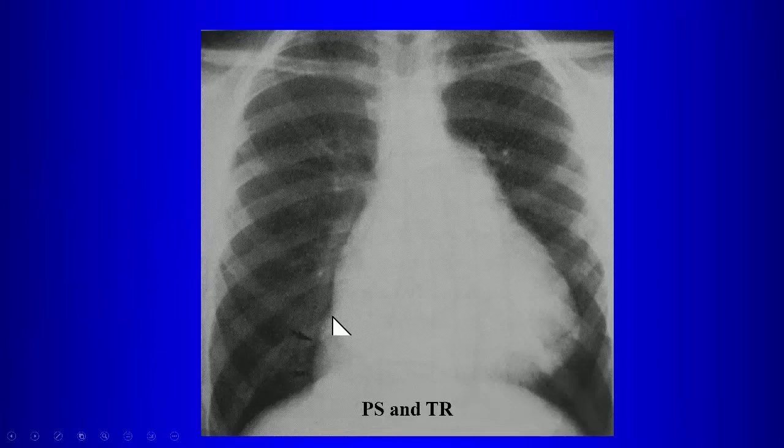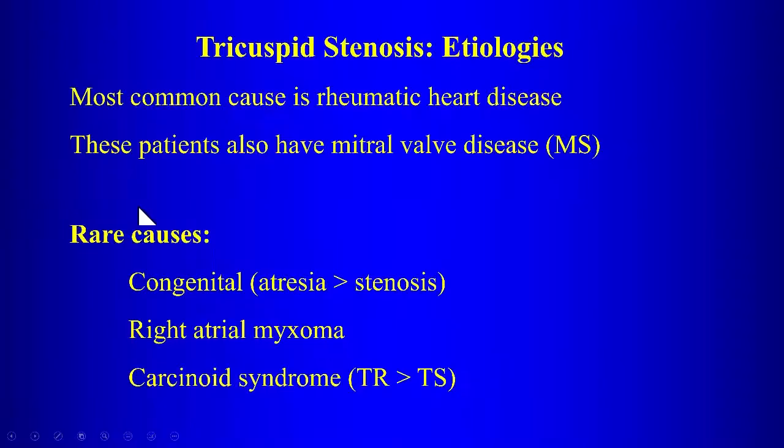So here's a case where we have poststenotic dilatation of the pulmonary artery, big right atrium from tricuspid regurg. That poststenotic dilatation is from pulmonic stenosis, dilated IVC from tricuspid regurg. So the combination of findings of pulmonic stenosis and tricuspid regurg, then you might consider carcinoid heart disease.